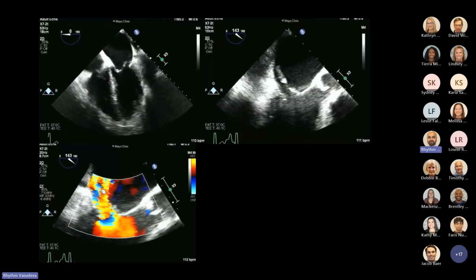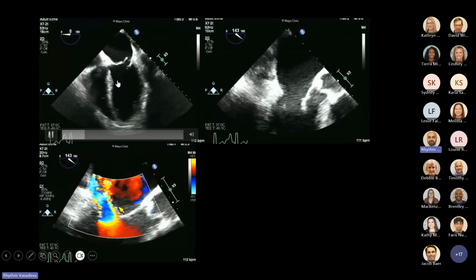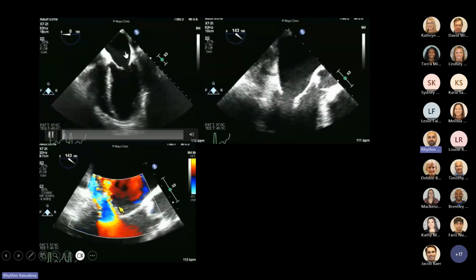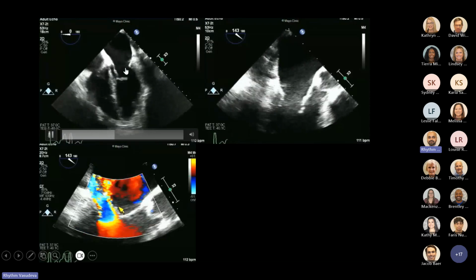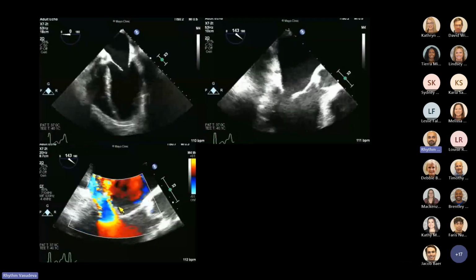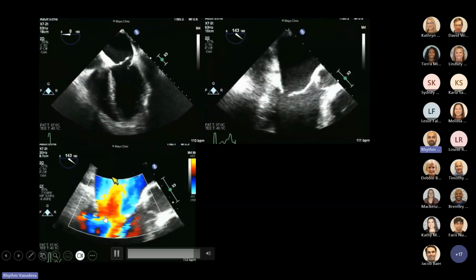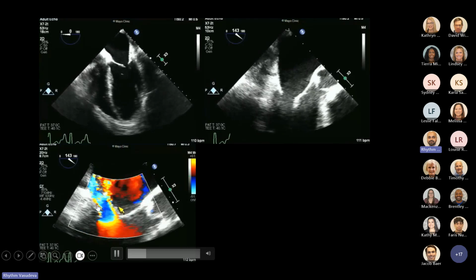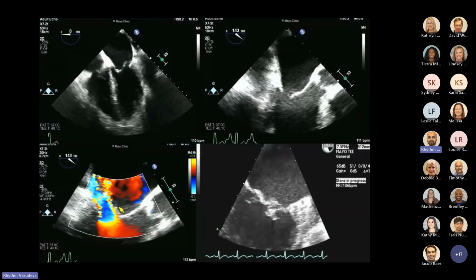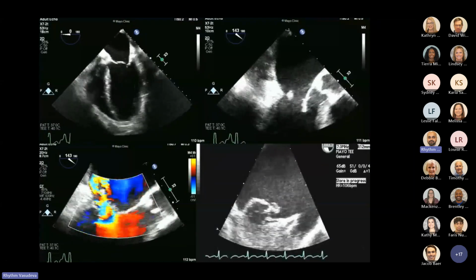Yeah, so as you can see, the anterior mitral valve is moving freely between the ventricle and the atria. It's just kind of flopping. And that's typical for a papillary muscle rupture. And you see the same here as well. It's just moving back and forth. And you have, in most cases, torrential MR to pay attention to. And here we see it can involve both valves, both leaflets.